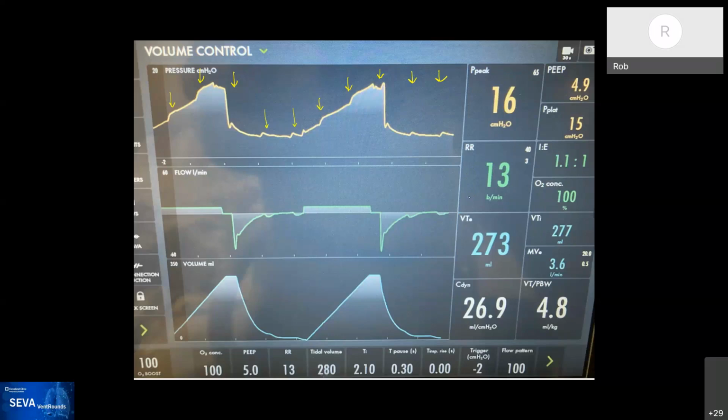What do you think about that? I think mainly about the airway, because my thought is that this is mainly coming from the atria hitting the main bronchi. And so the more pressure there is or inflation of that, the more it's going to transmit. So it's very similar to what you're thinking. If the pressures are recorded high, it will transmit it.